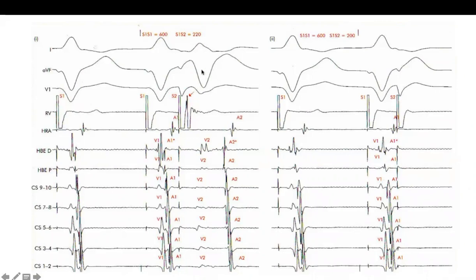There is recorded ventricular activity, and there is what we call latency between the stimulus and the recorded electrograms, which is not present here, because the time from here to here is enough for the tissue to recover completely, so it can be excited immediately.